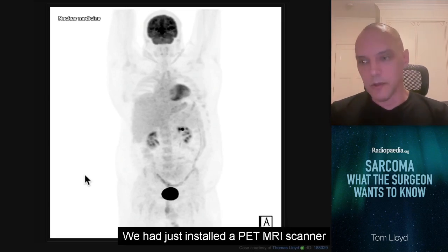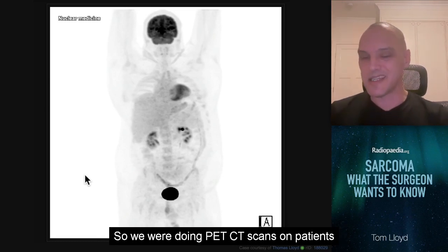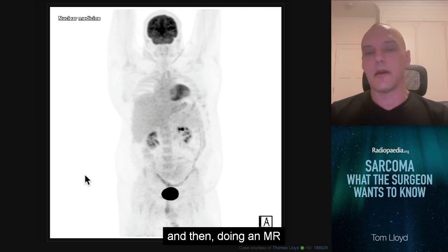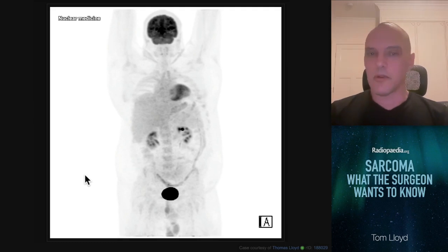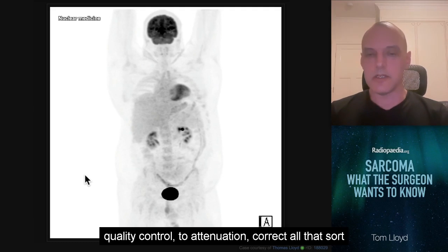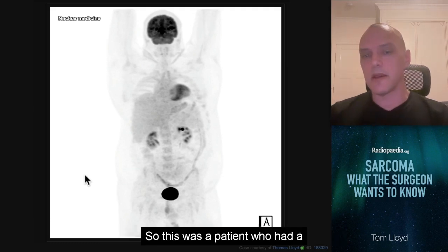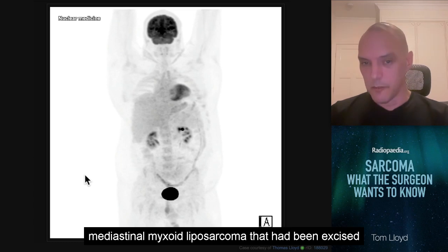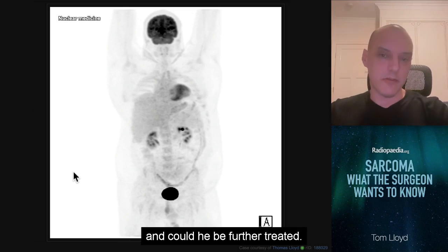We had just installed a PET MRI scanner, and we were in the process of quality assuring it, so we were doing PET CT scans on patients and then doing an MR, using the PET MR on the same patient to quality control, to attenuation correct, all that sort of stuff as we were getting used to the scanner. So this was a patient who had a mediastinal myxoid liposarcoma that had been excised with positive margins, and they did a PET scan to see what they were dealing with and could he be further treated.